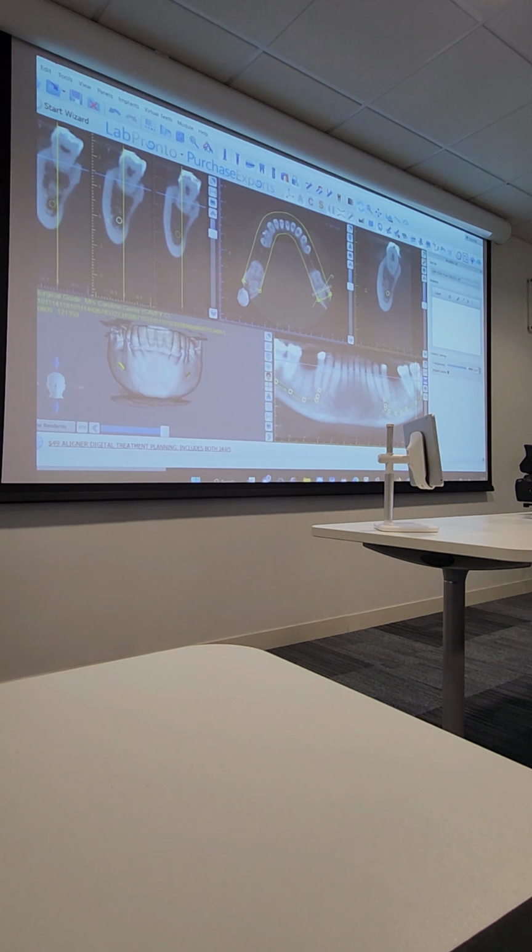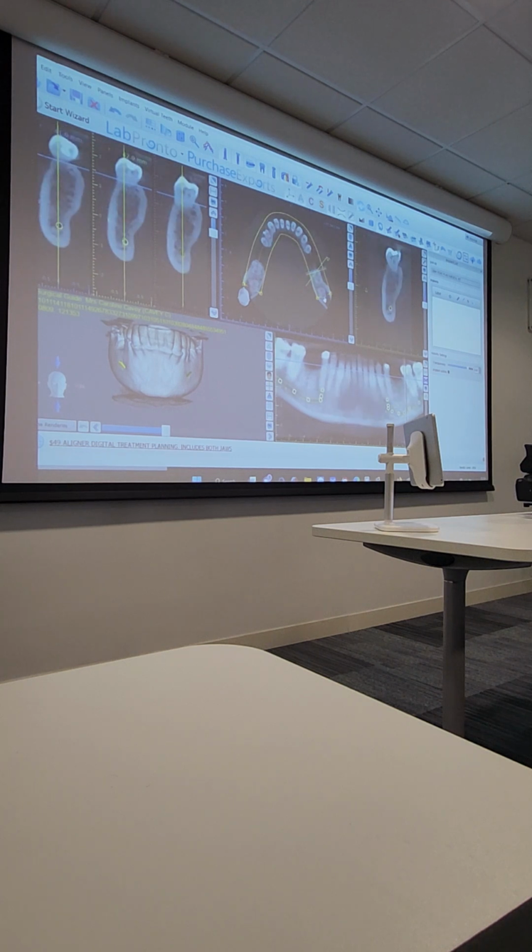So, to do a panoramic curve, you go to draw panoramic curve. Press on that, and then you press one click with your left mouse, and then you do another point, and it starts to stitch everything together. Okay? And then you just carry on to the other side, double click, and that's done.